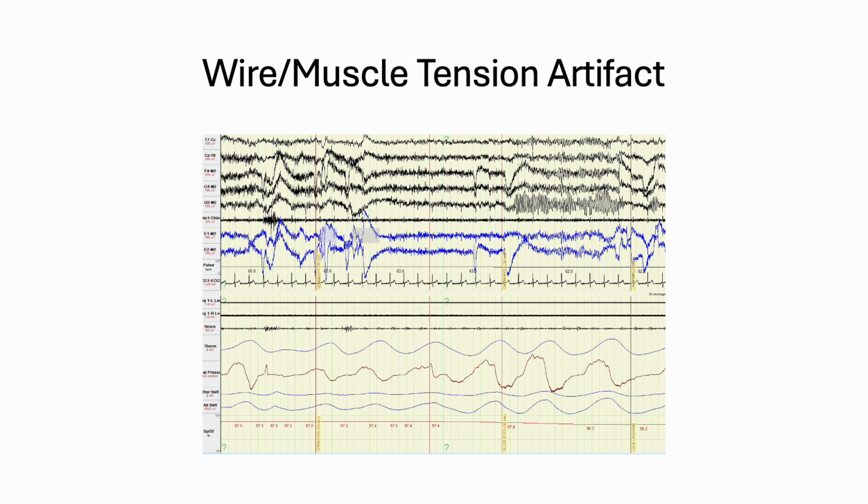It's kind of remarkable if you figure out that you've been making a face for a while at someone and then you don't realize it, and then you relax your face. This is before you relax your face. This is kind of what it looks like. They're very tense. So this is either tension on the wires, they have tension in their face, or this could be 60 hertz where you haven't scrubbed enough. Any of those could be it.